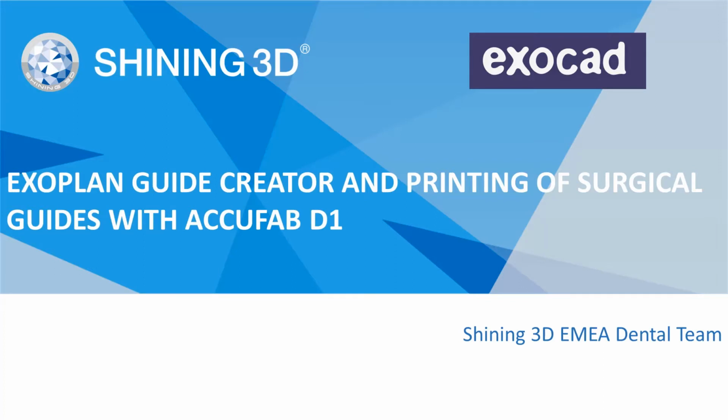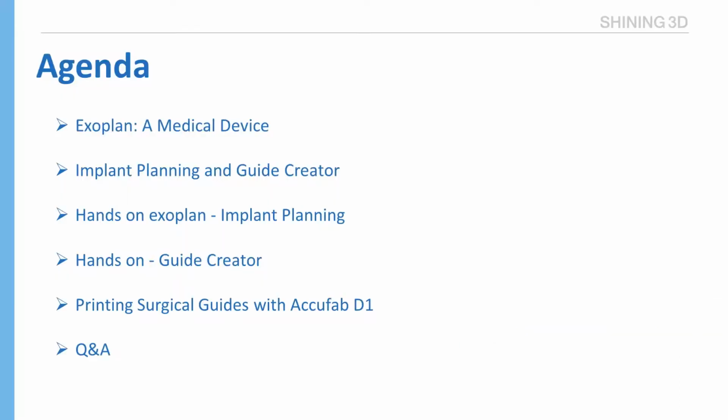This is Riccardo, and today, together with my colleagues Filippo, Simone and Rita, we will have a look into the digital workflow provided by the integration between EXOPLAN and the Shining 3D printing system with the DLP printer AccuFab D1. Let's have a look at today's agenda.